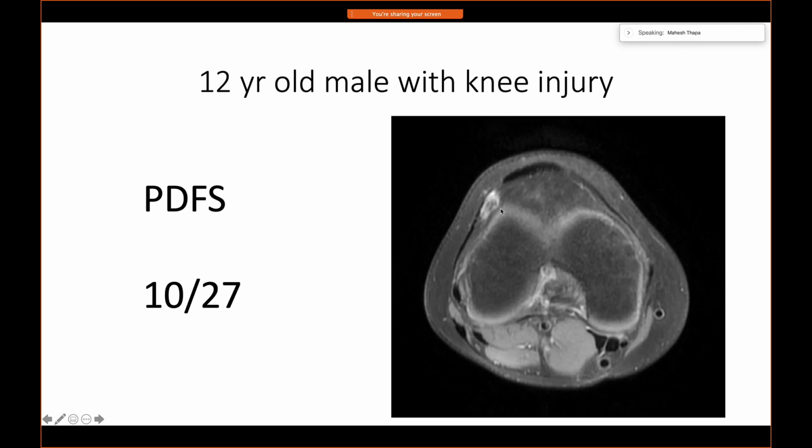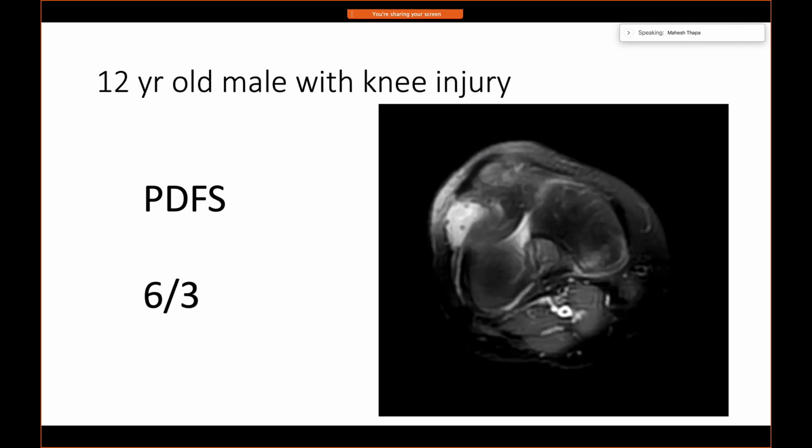But this is a little funny for a soft tissue injury. Hopefully people see that, is that because there's nothing overlying in the subcutaneous tissue. There's no bony contusion. Just this little thing looks somewhat innocuous, but not quite normal. So the patient felt better and was lost to follow-up, and then came back later. Now this same kid in June of next year with something bigger in that area.